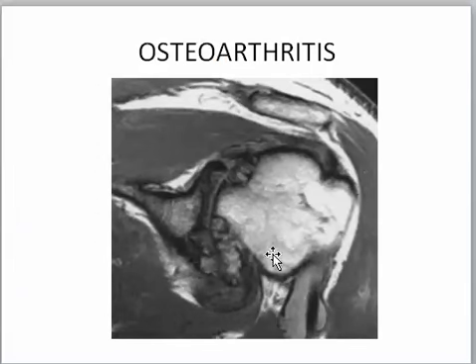Another case of osteoarthritis, not acromioclavicular, but osteoarthritis of the shoulder joint itself. And if we want to describe this, it is so simple.